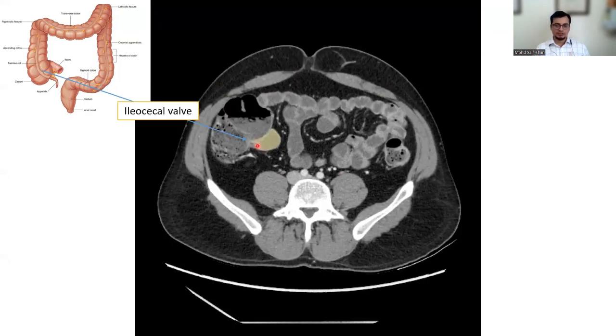Okay, you can observe the sphincter muscle. That sphincter is important to regulate intestinal transit. It acts as a barrier to delay the passage of small bowel content, and hence increases absorption in the small bowel. It also prevents reflux of fecal matter in the cecum back to the ileum. So that is a valve, okay, the ileocecal valve.